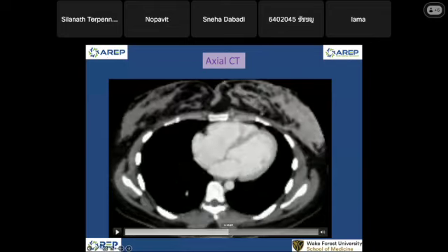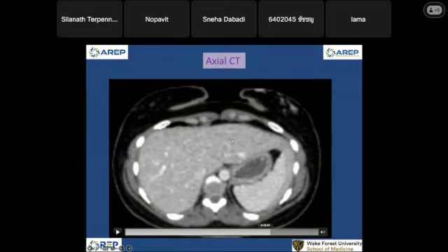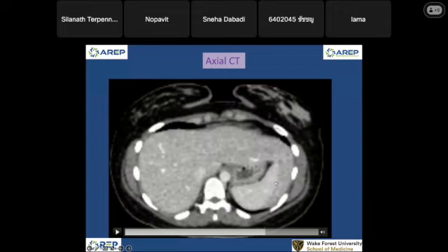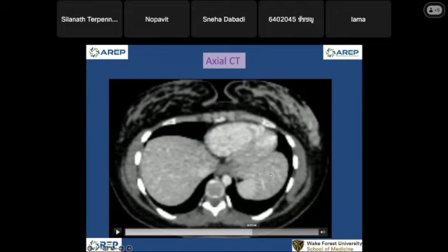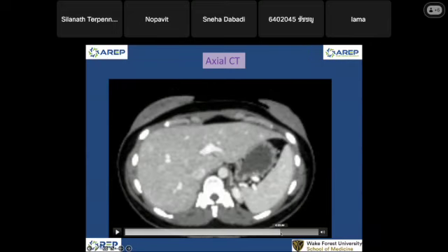And look at soft tissue, look at bone. I apologize, I don't have a bone window for you, but let's look at the belly a little bit. This is my liver. The liver is so long, not big, across the midline. The liver shape has a lot of variation. Sometimes it's so short, sometimes it's so long. So across the midline here, and it is even wrapping around the spleen. See that? All this liver enhancement is different. This is the spleen, part of the spleen. The spleen is wrapped by the liver.